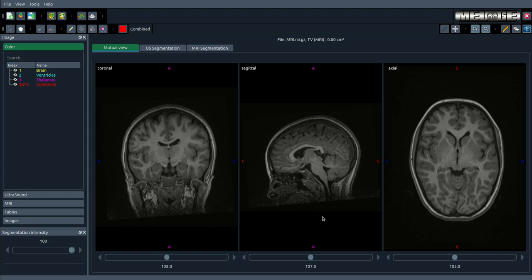This tutorial demonstrates the simple but crucial task of saving and loading projects in Melage. These features help ensure that no part of your workflow is lost and that you can manage multiple projects effortlessly.